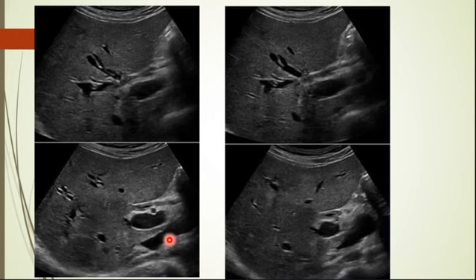Another and the last example is dilated intrahepatic biliary duct caused by primary sclerosing cholangitis in patients with long-standing ulcerative colitis. And this should not be confused with the Klatskin tumor, dilated intrahepatic biliary tree and extrahepatic. Klatskin causes only intrahepatic dilatation because it obstructs at the liver hilum.